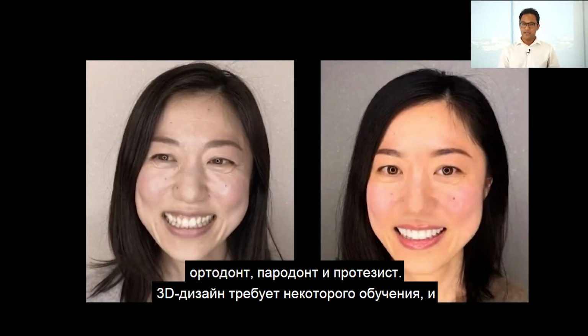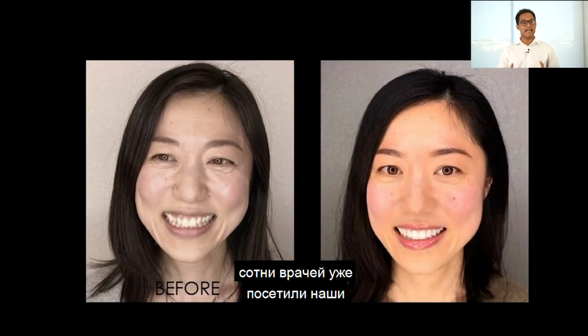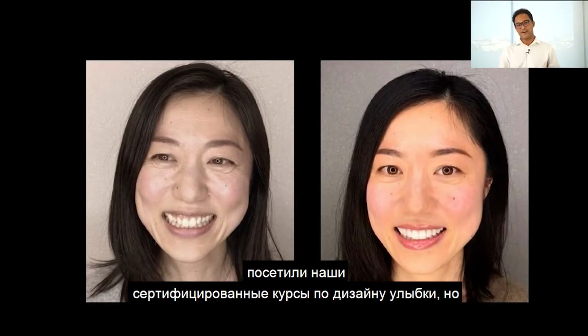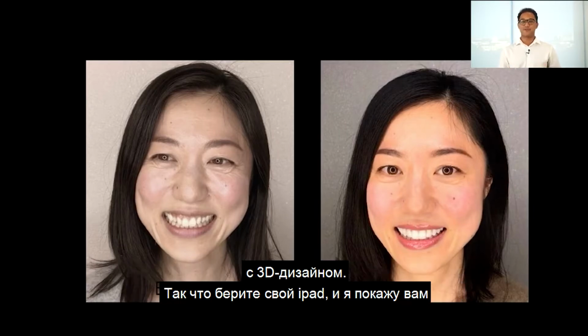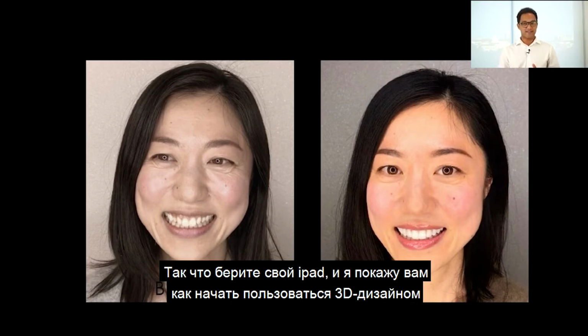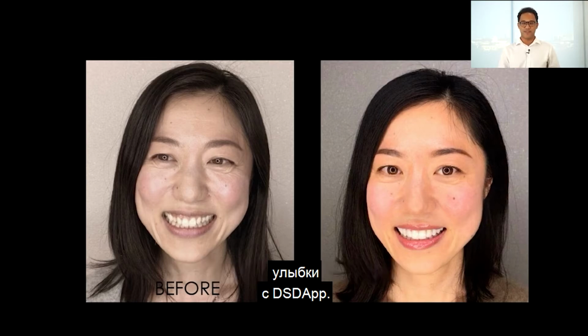The 3D design requires some training, and hundreds of doctors have already attended our Smile Designer certification course. But I want you to get your first experience with the 3D design, so grab your iPad and I will show you how you can start practicing 3D smile designs with the DSD app.